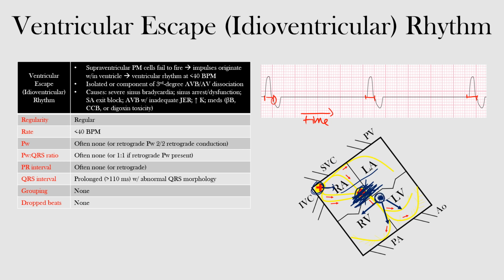as well as a ventricular rhythm, okay? And in such cases, you may have what's called isorhythmic AV dissociation, in which the P waves and the QRS complexes are firing at the same pace. If you imagine this as a P wave, these small P waves, you can see them appearing within there, okay? Now, that's not always the case, but that's one setting where we can see sinus P waves in the setting of complete AV block.